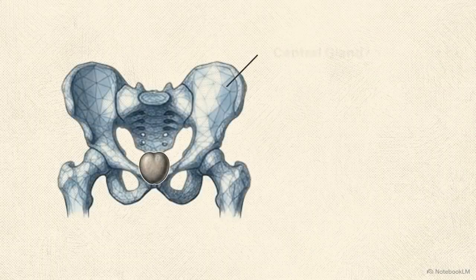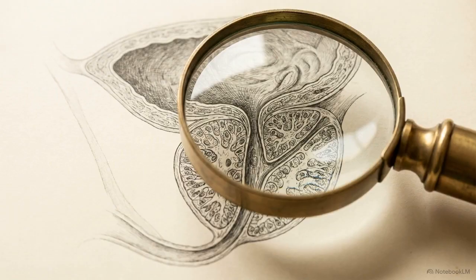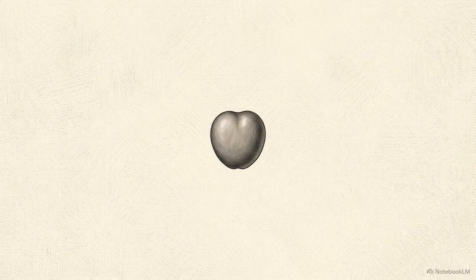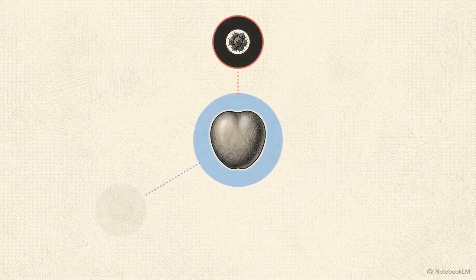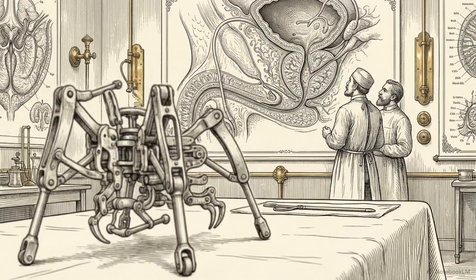When radiologists rely on generic anatomical terminology, they create ambiguities for the urologists and surgeons executing the procedure. To provide actionable data, the prostate must be viewed through distinct lenses. Its anatomy is mapped using specific criteria dictated by the pathology: oncology, benign prostatic hyperplasia, or infection. Mastering these three clinical contexts makes the radiologist a primary architect of the patient's surgical plan.